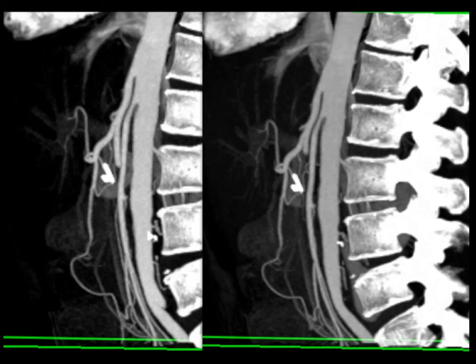But again, simply seeing a narrow angle is just not going to make the diagnosis of SMA syndrome. You'll mention it, and sometimes I'll see it, but the bowel's not dilated, so I'll mention it, but I'm not going to call it SMA syndrome.